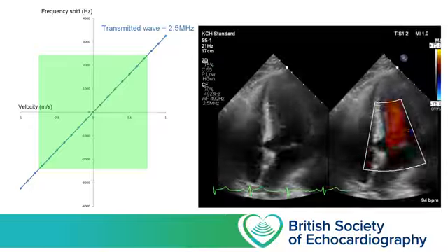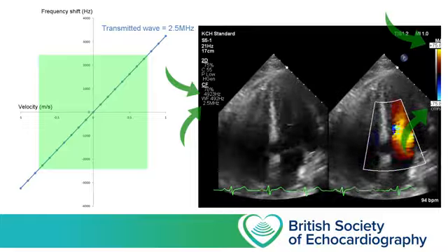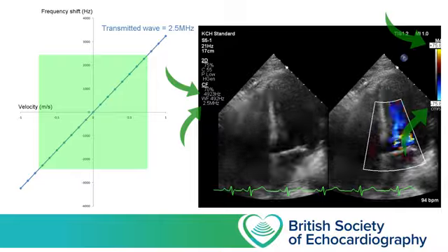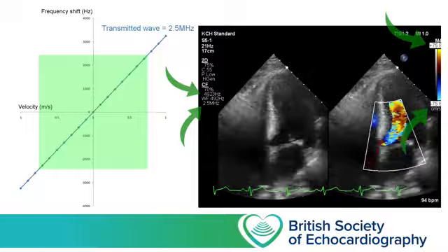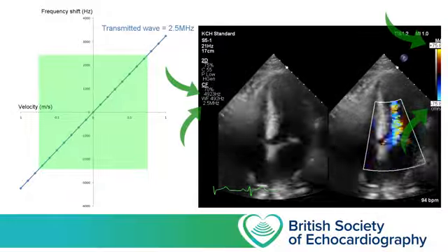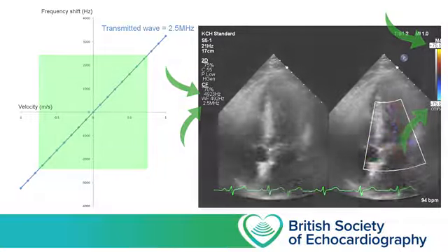So here's our same clip again, and if you look on the far right of the image you can see the colour scale displayed, and you can see that the ultrasound software is telling you that with the settings as they are here, the maximum velocity that can be displayed is the 75.8 centimeters per second that we anticipated. When the observed velocity exceeds the upper bounds of the scale, this is when aliasing occurs. Let's have a look at what this looks like on a different clip.